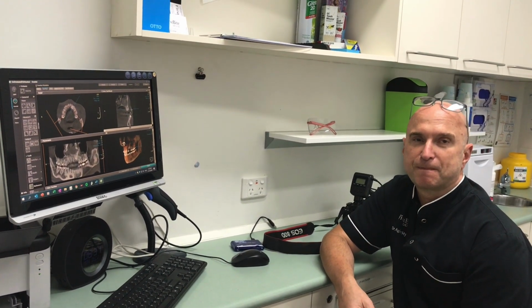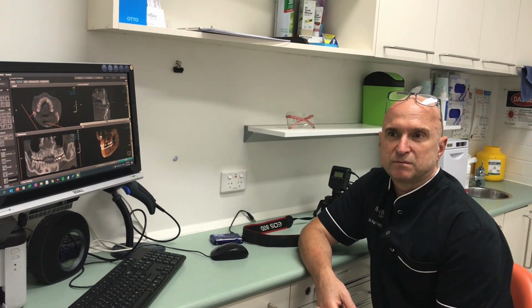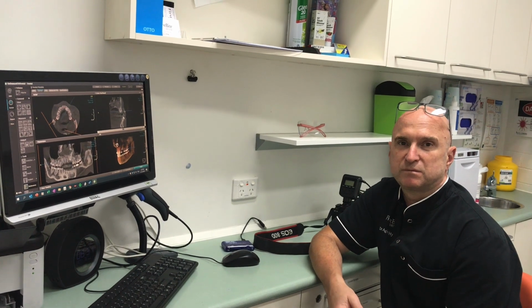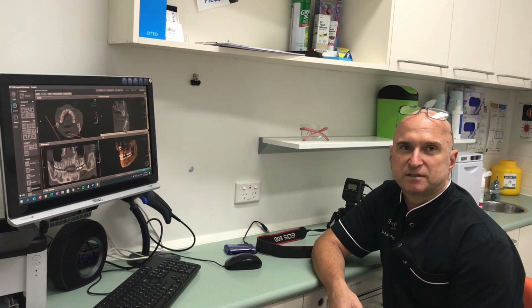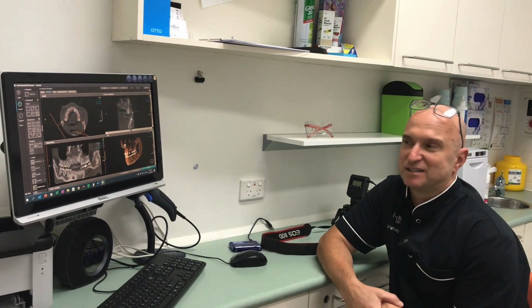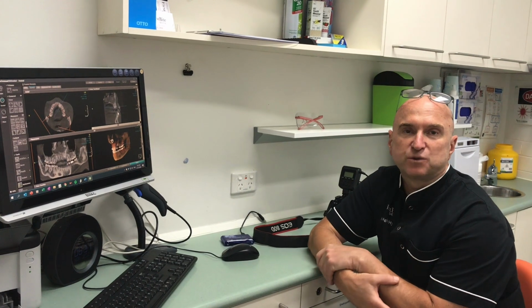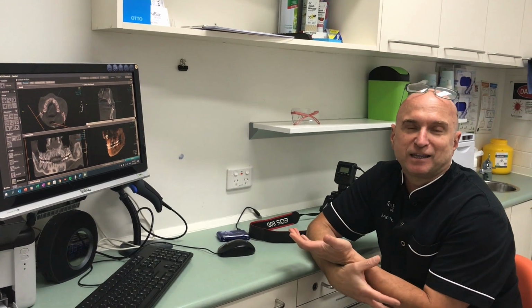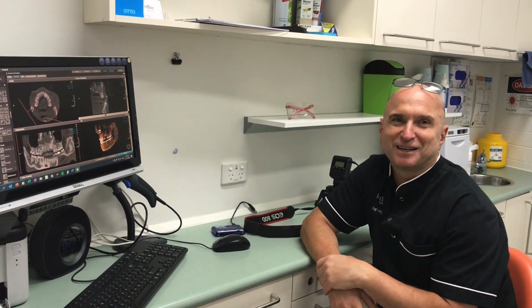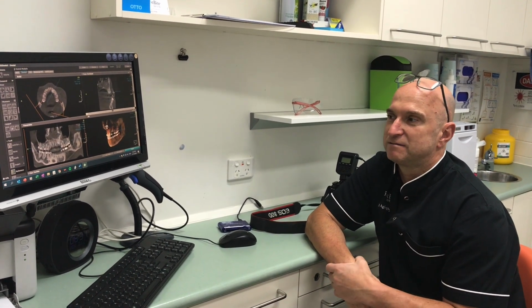And how do you find that is taken by the patient? Are they happy to pay in most instances? Not really much of a problem at all? No one ever questions it. I didn't think so. Yeah, there's not a question. It's just that's what we do, and that's what they need to do. Yep, to be able to do it. We'll put it this way: if I don't take the X-ray, the surgeon will take the X-ray. Someone's got to take the X-ray, so I might as well take it myself.